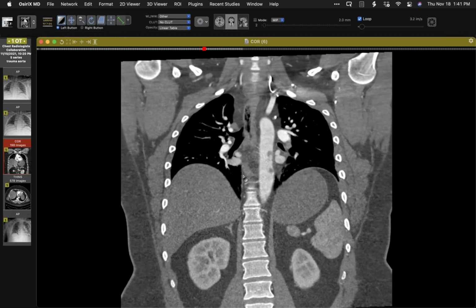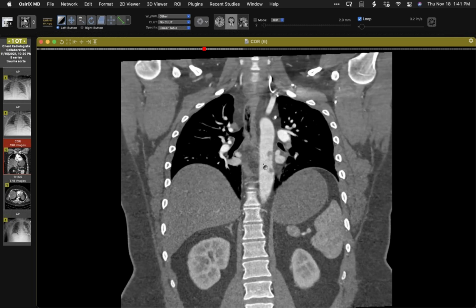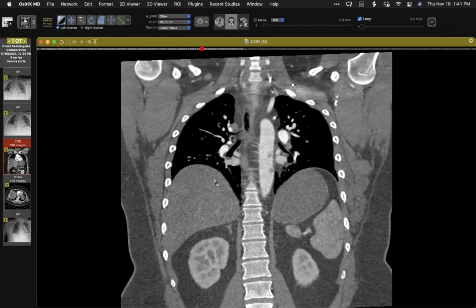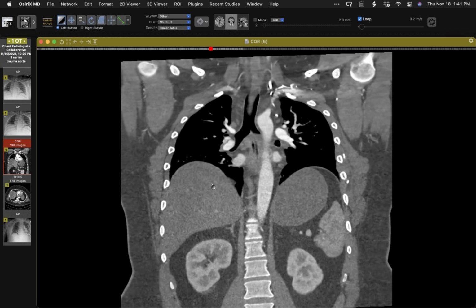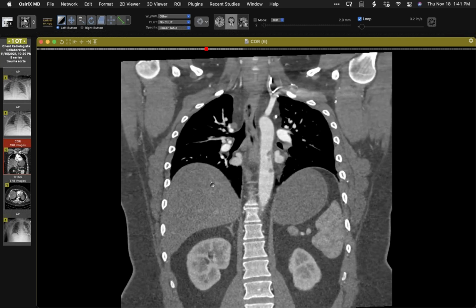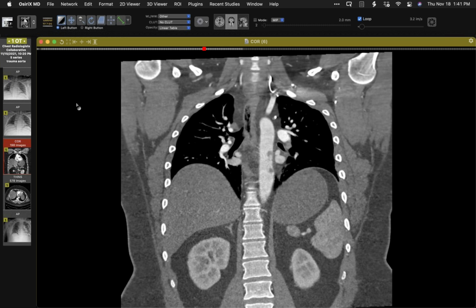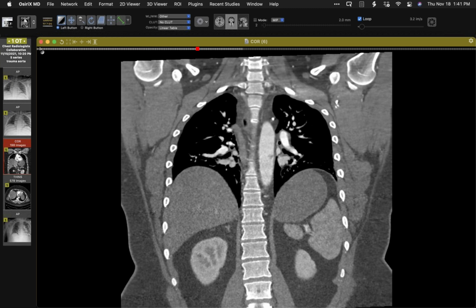Now, this patient had a CT about 24 hours later, which I only became aware of today, so I didn't have time to match it with this one. But these findings are still there, about 24 hours between the two exams. Of course, they're not going to intervene for that. So minimal aortic injuries, plural perhaps, with a little adherent thrombus.